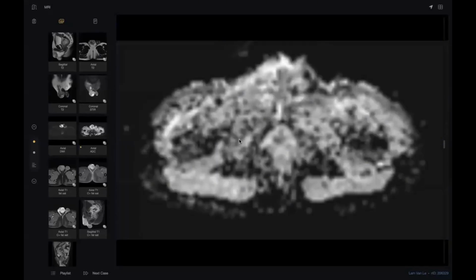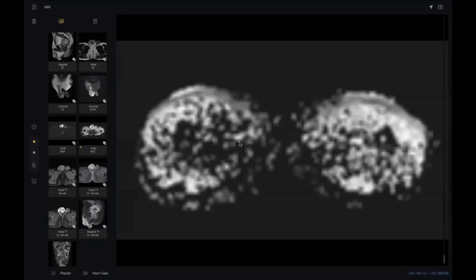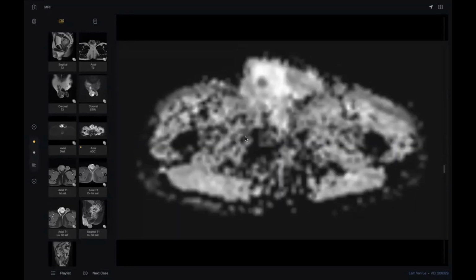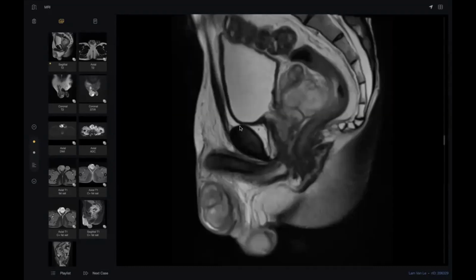Lymphoma can be a differential in this case. Other possibility of testicular tumors. What else? Lymphoma, germ cell tumors usually occur in the young age group. The other possibility can be a seminoma. Look here again. What happened here and here? Both are of the same process.